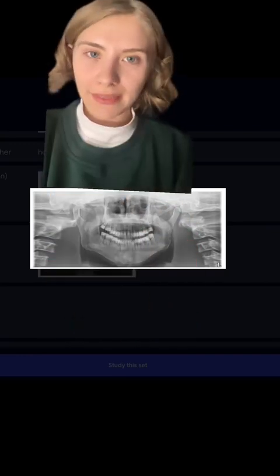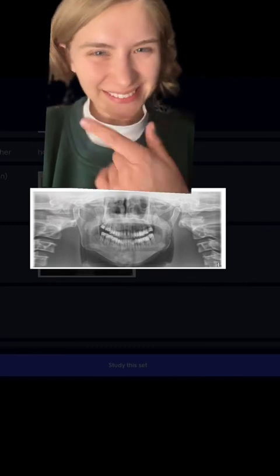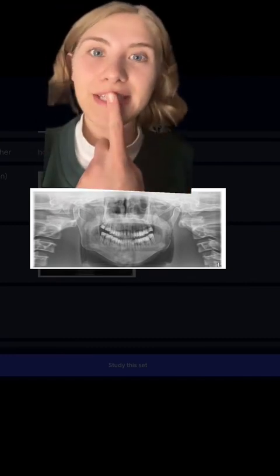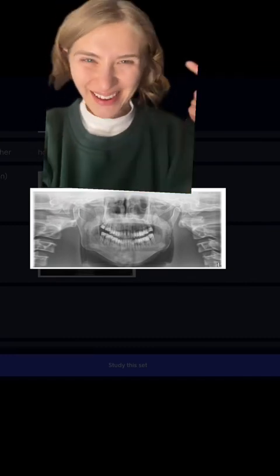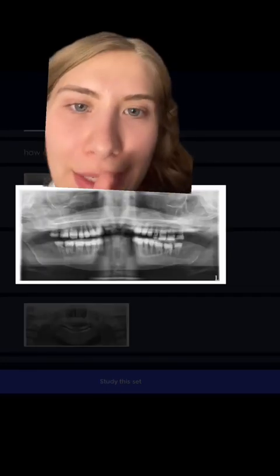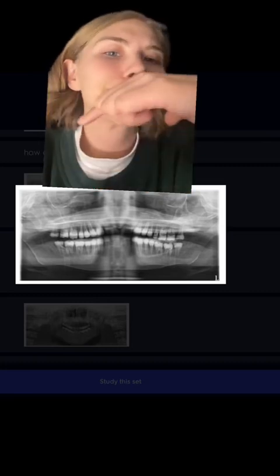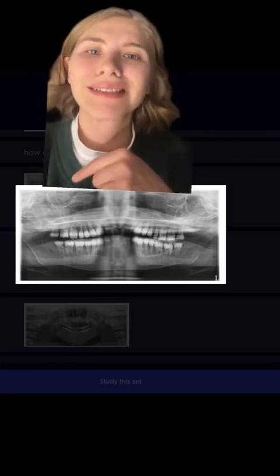This one looks extra smiley. So the way I think of it is that Smiley movie, when people are super smiley. Think about their chin is too tipped down because they're smiling too much. So that's a super easy way of remembering that. This one, they're too far up. Their chin is too upwards. So it's like an upside down smile or like really weird.